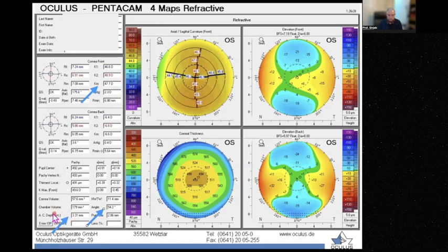Be careful when you read it. It should be internal, not external. External means including the thickness of the cornea. So it will give you false deep anterior chamber evaluation. So here it is internal 3.3. Wow, that's perfect. And here the angle, it should be at least 35 degrees, at least.